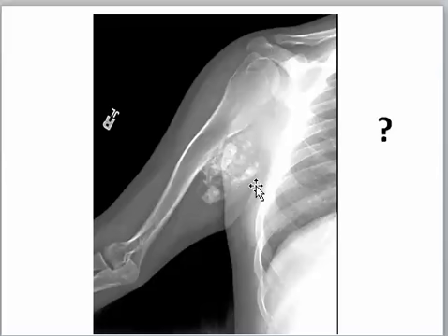Here, if you look at this, there are some bony changes, and the pattern of calcifications here is amorphous. They are not patchy as new bone formation elsewhere, but as you see, linear, curved, mottling. This is characteristic of chondroid matrix, and this proved to be osteochondroma going to chondrosarcoma. So this is a chondrosarcoma.